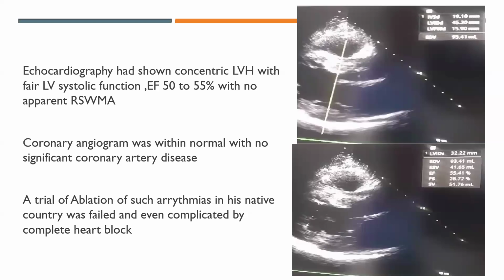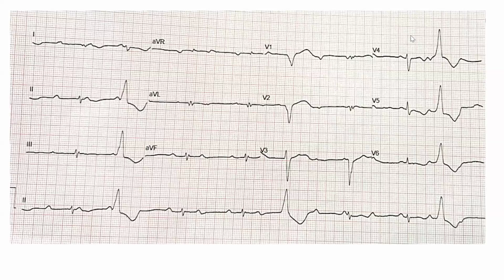So when he traveled to Egypt, he came with such an ECG. As we can see, this arrival ECG shows complete heart block, complete AV dissociation, and multiple frequent PVCs. Even the PVCs have a different morphology from the two recorded tachycardias. This means there is a lot of pathology in such a patient.